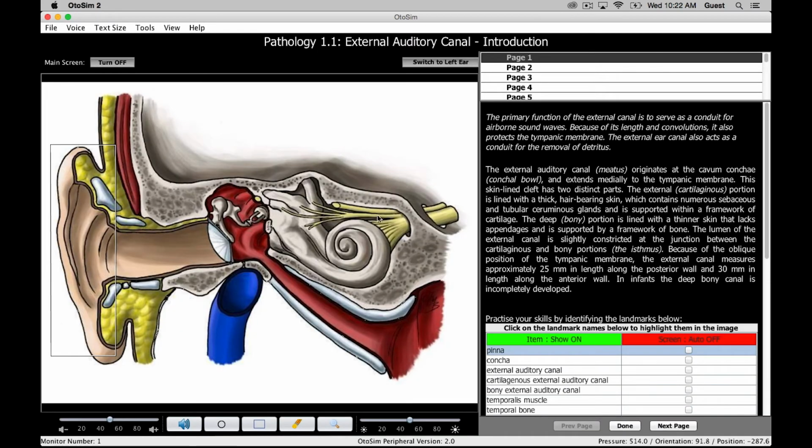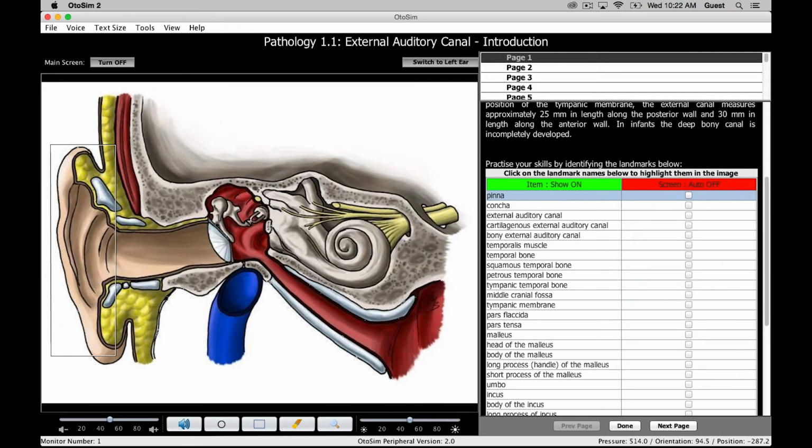In the introduction section now, we will repeat some of the things that we learned in the first part with respect to our anatomical knowledge. And you'll see again when these two charts appear that we can now identify the structures on the main screen. This first picture is not to be used in the simulator, but is to review some of the relevant anatomy, which is the teaching ability of an instructor to the student.